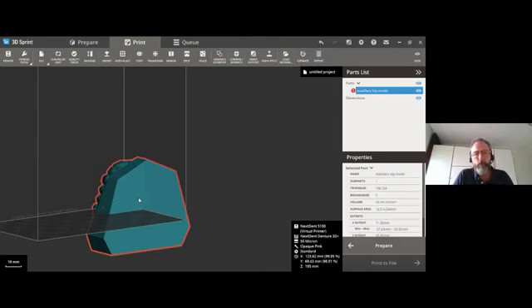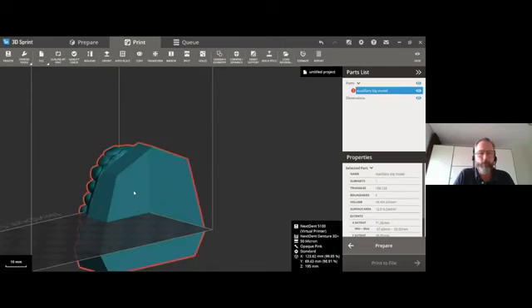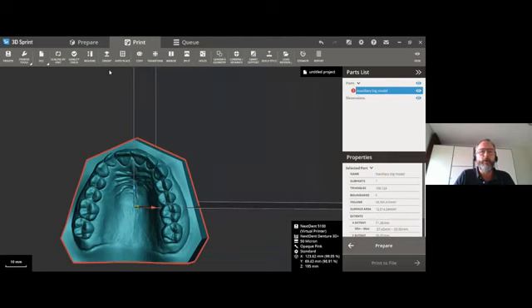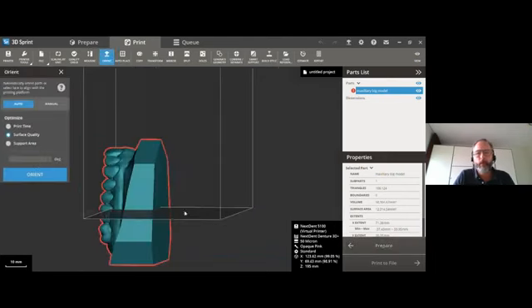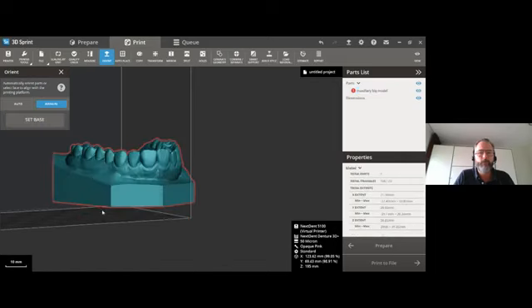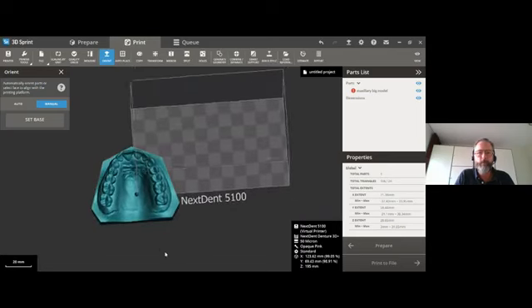So if you can give this information to your STL file so that this is the bottom of the part, then at least the part will always come in like so. And a number of models from different software companies already have this.